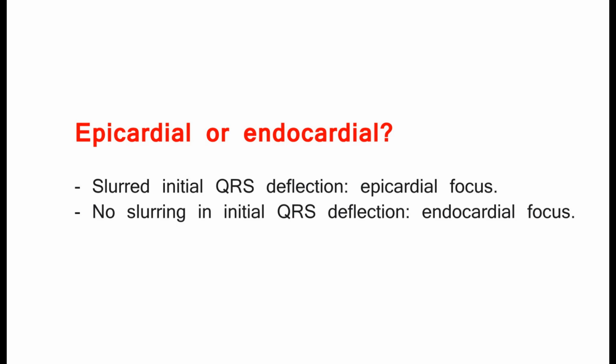Epicardial or endocardial. Slurred initial QRS deflection, epicardial focus. No slurring in initial QRS deflection, endocardial focus. Other criteria.